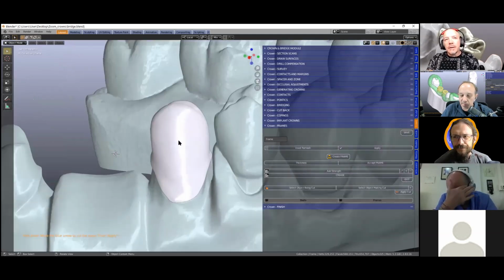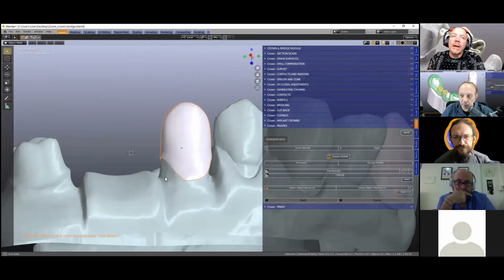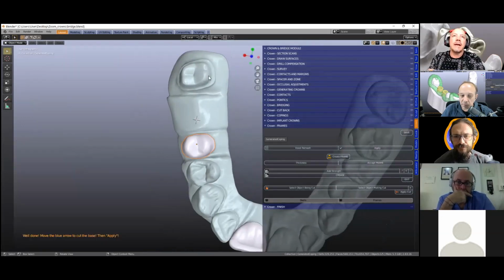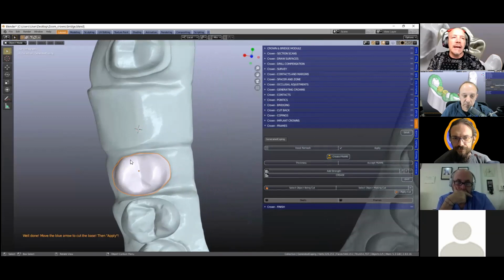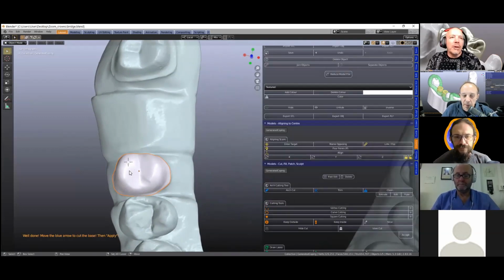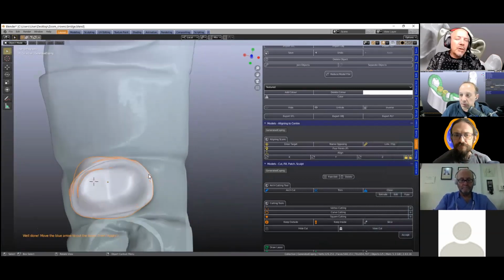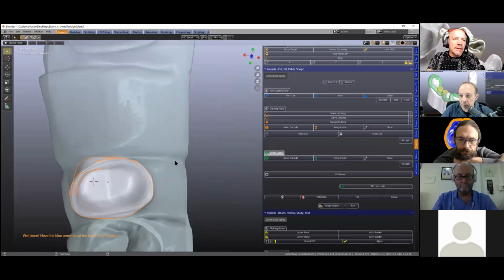I think you can, if you do this at 0.4, for example. And then we'd have to look through it to see the preps. So we're not really surveying. We could use the model designer, maybe the vertex cutting tool. We could look through it and see. Just lasso it. Yeah, we just take a lasso and make a cut where we need to cut.